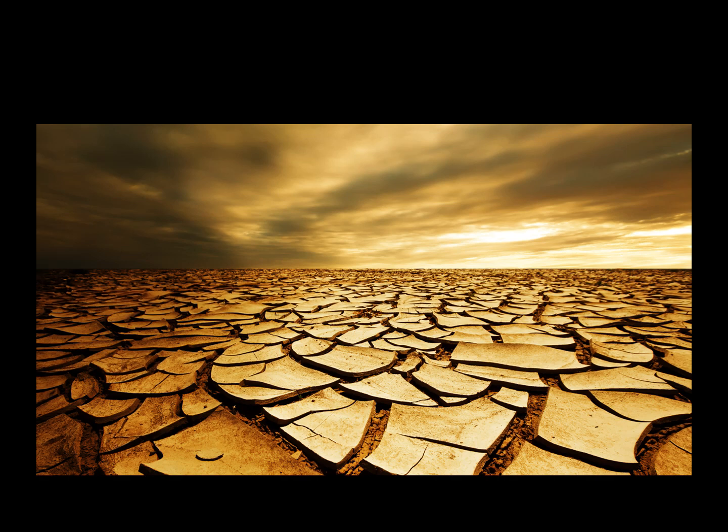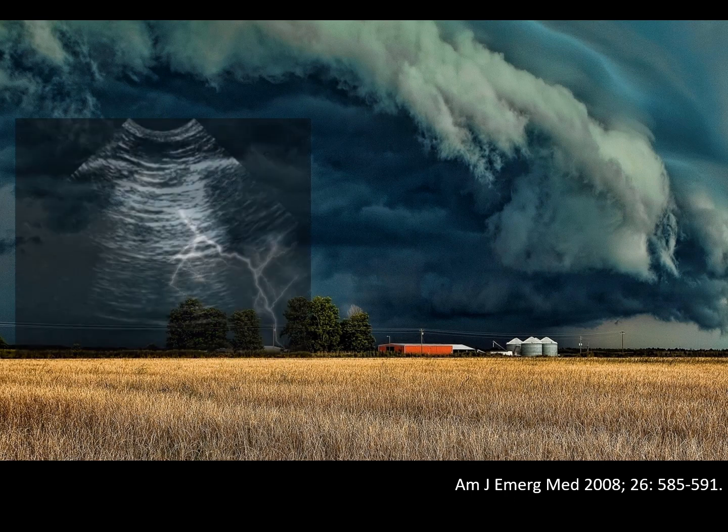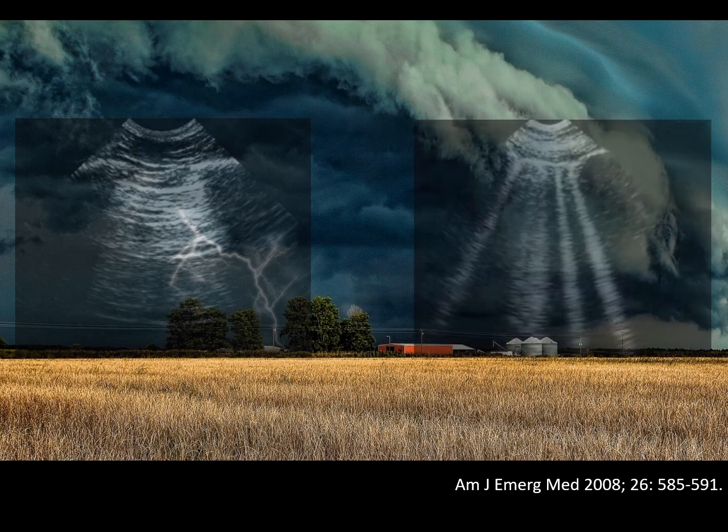Lack of B lines can perhaps be used as clearance for fluid therapy. Their absence indicates dry lungs. They can also be used as an endpoint for fluid therapy. The apparition of B lines occurs prior to hypoxemia and can provide an early warning of impending alveolar edema.